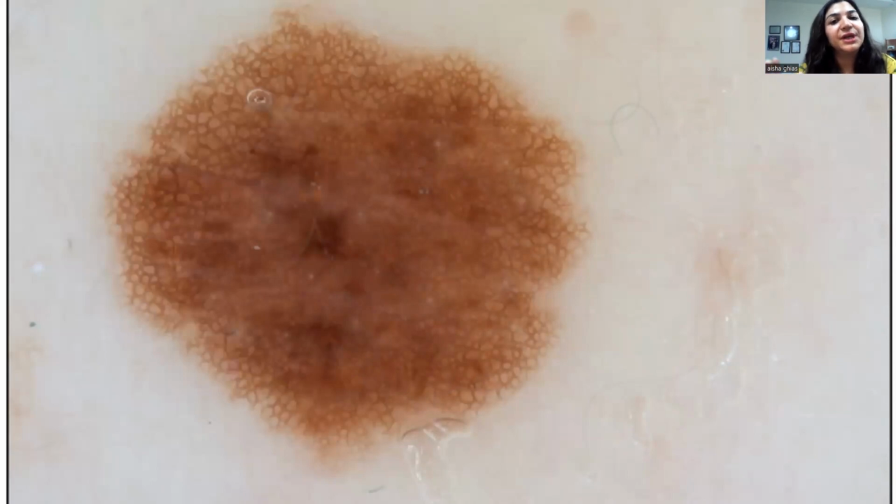हर लीजन को डिटेल से एनालिटिकली देखने की जरूरत नहीं होती. With the passage of time, you learn that which lesions need really your time and which lesions do not really need your time. और उसके ऊपर आपने instantly बस बता देना होता है कि fine इसकी biopsy कर लो. अच्छा ठीक है इसकी biopsy की जरूरत नहीं है. Call him after 6 months. See, so that's how you get more and more confident about it. The purpose of showing you these elephants is a little bit saving the time, making you able to be confident about some lesions that you may not want to spend more time on.